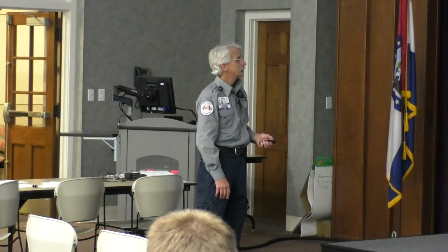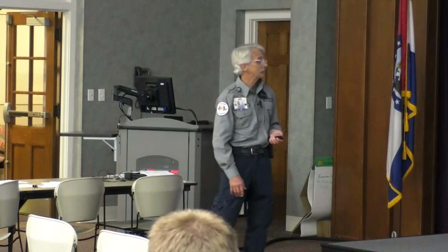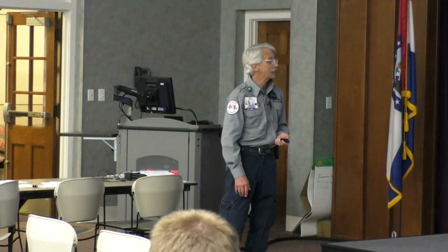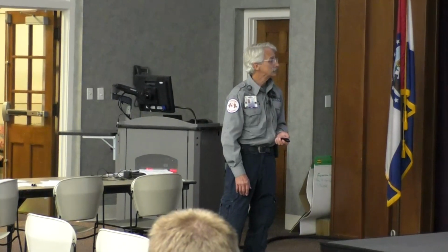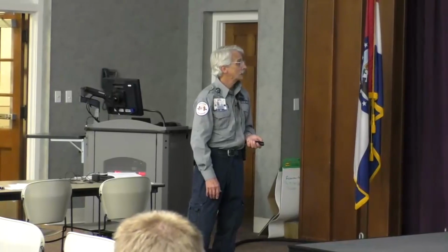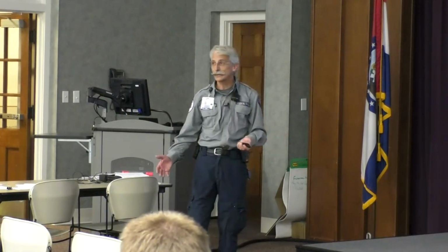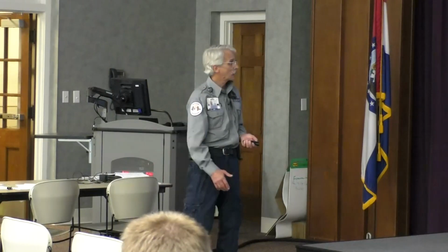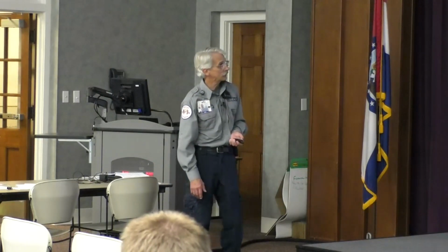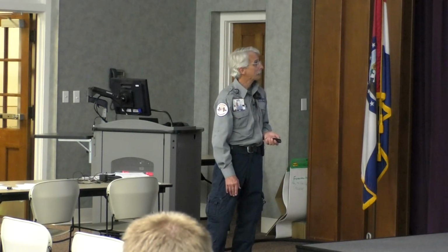All right. So, where's the MI? Depression, 2, 3, AVF, elevation, yeah. So I've got reciprocal changes. Probably V1 through 5. I go with that. Is there any others?